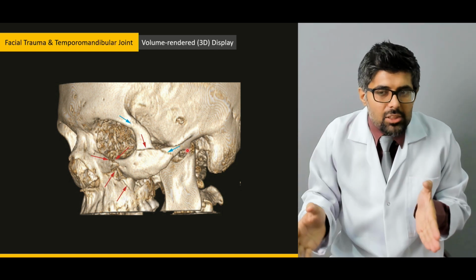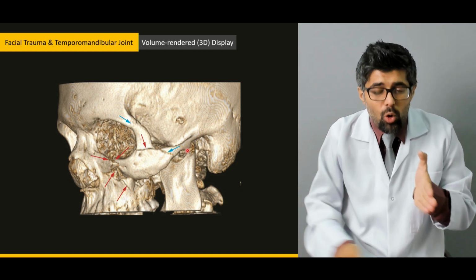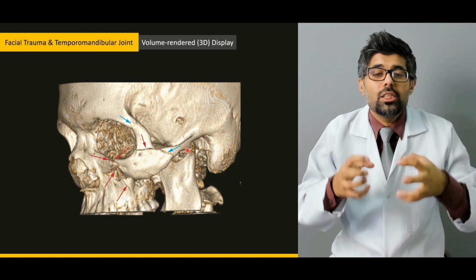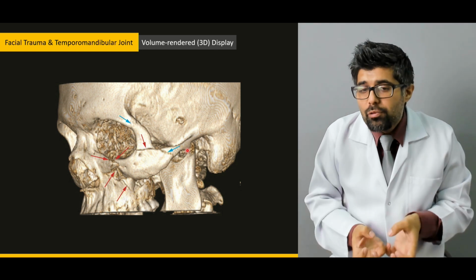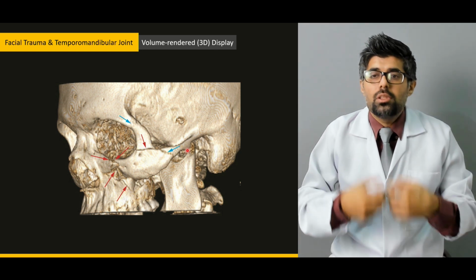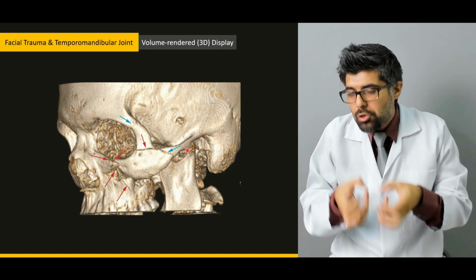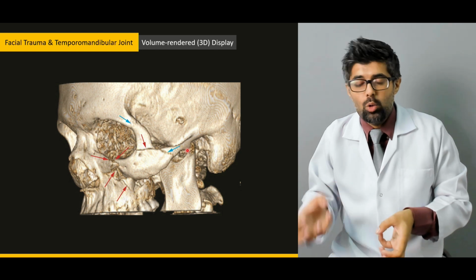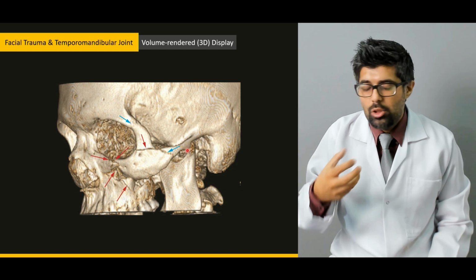The X-ray is happening all around the skull, and all of this X-ray projection is producing a specific view, and all of that absorption and transmission of X-ray can be composed into a 3D structure.